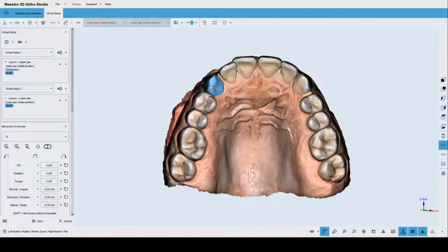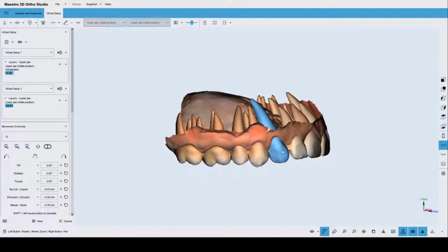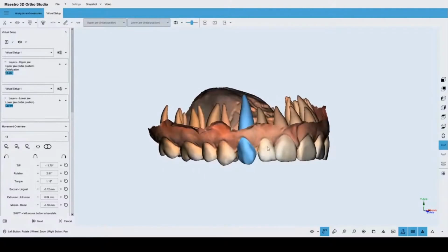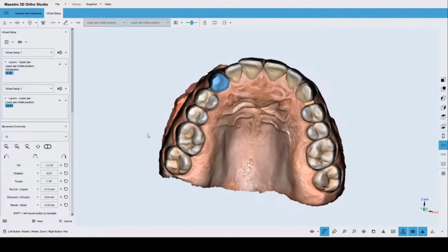Consider that, okay, I have selected, you see, only one tooth in this moment, and I have performed the movement using another approach. So I have just moved the tooth using the mouse. So I have basically moved my tooth using the mouse, and in the same way, just using the mouse, I can rotate the tooth with respect to the current view direction.